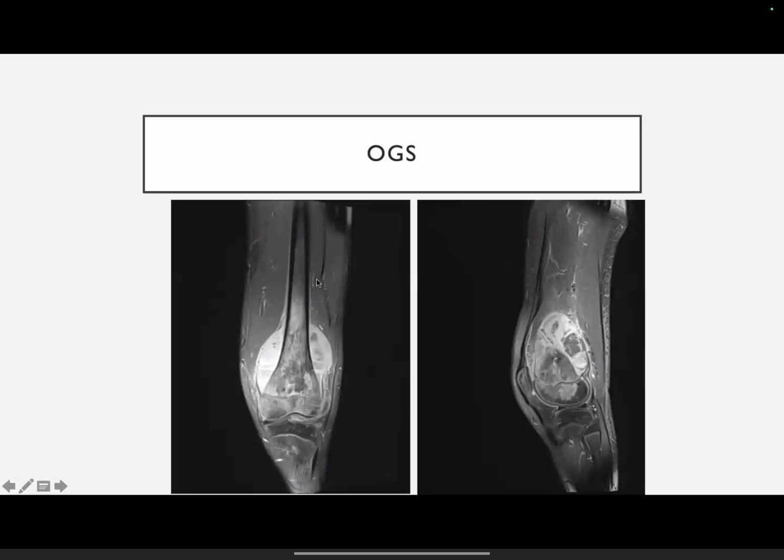And we need to mention in such cases the extent of the bone marrow edema. The tumor surgeon requires the length so that they can see what length has to be salvaged and what length implant they need to put in.